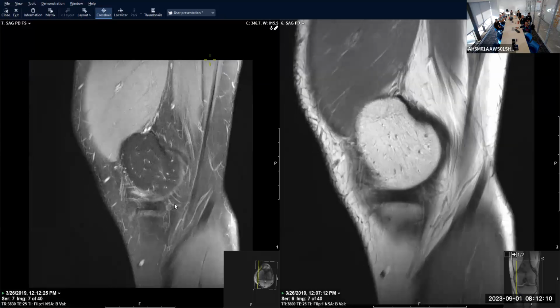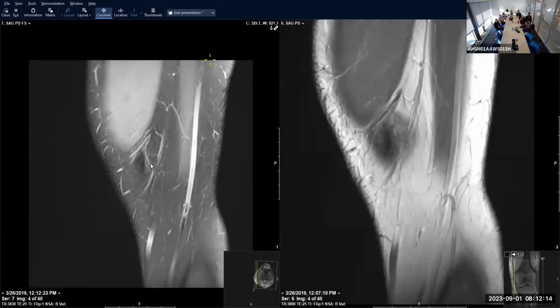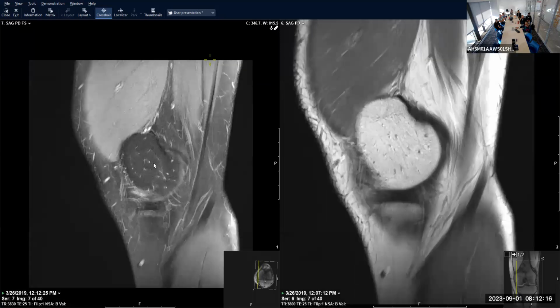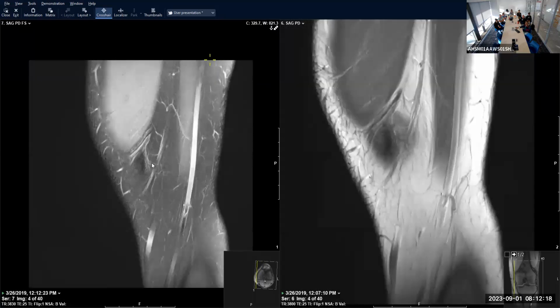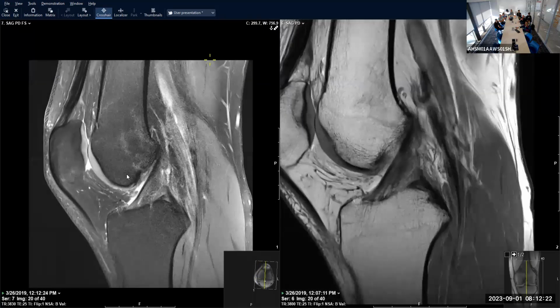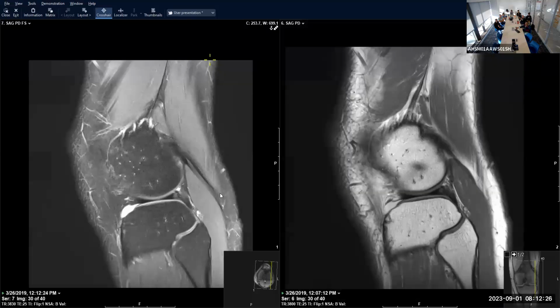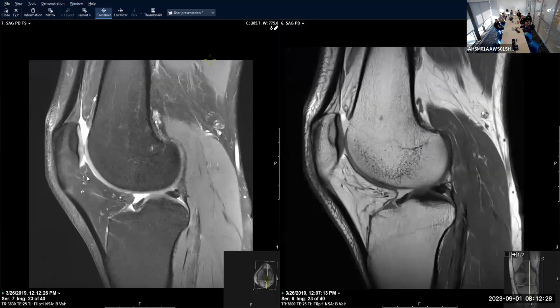So the medial meniscus is looking pretty good. Once you get out here, you see a little bit of MCL. If I see soft tissue edema here, then on the coronals I'll corroborate whether or not there's an MCL sprain. I have a list of some things that I look for. If it's a normal knee and I don't have a good explanation for the patient's pain, I think the most common is in Hoffa's fat pad.